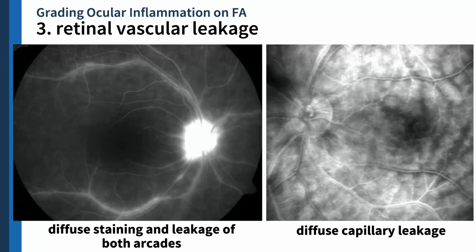Okay, so when there's leakage in the capillaries, that actually represents the highest level of inflammation in terms of retinal vasculitis. And that's why later, tignan ulit natin yung grading system, you will see na the score assigned for retinal capillary leakage is actually medyo skewed, mataas talaga. Kasi if you have leakage in the capillaries, ibig sabihin, very inflamed talaga yung mata ng patient. So leakage in the main vessels, while still representing inflammation, is actually a lower level compared to capillaries. Okay?